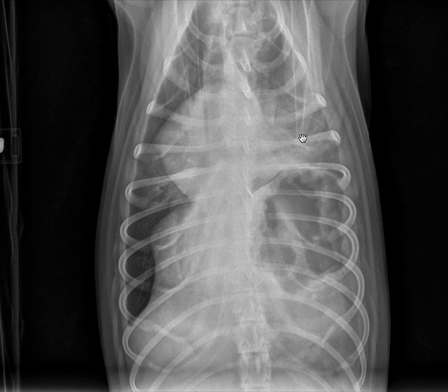The lung changes that we see are most severe on the left, but a little bit in the right middle lung lobe, and these may be due to contusion from the vehicular trauma and or a component of hypoinflation and atelectasis from the diaphragmatic hernia.